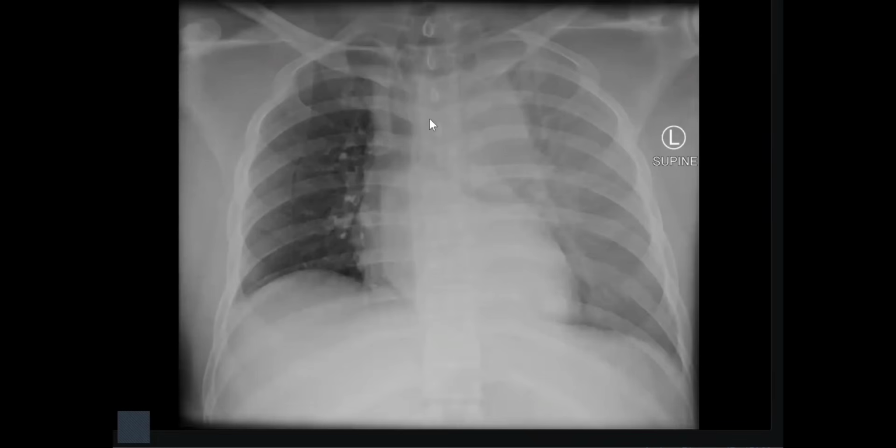This is another case which is very important, by the way, for long, short, and oral exams, but especially for short reporting. Again, a mediastinal mass in the acute setting could be a mediastinal hematoma, either of aortic etiology or of venous etiology.